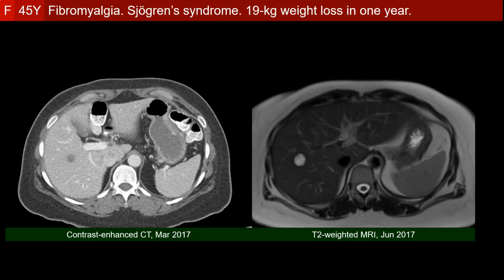If you are reporting from a workstation, estimation of the size of the lesion is easy by measurement. If not, then you may need to assess the size of the lesion visually in comparison to a recognized anatomical landmark or to the scale given to you, if this is available.